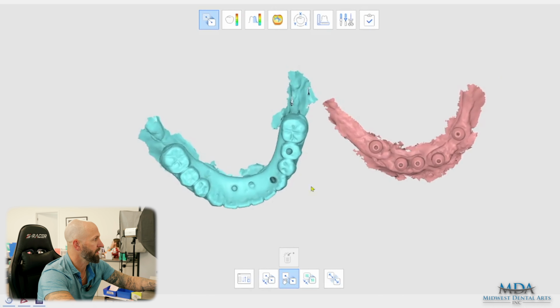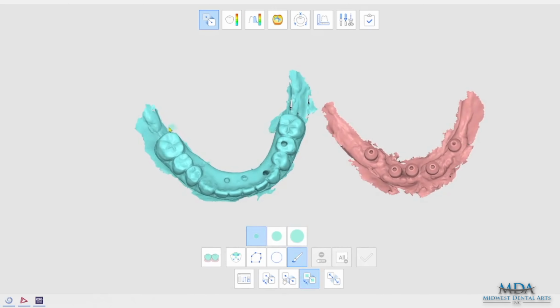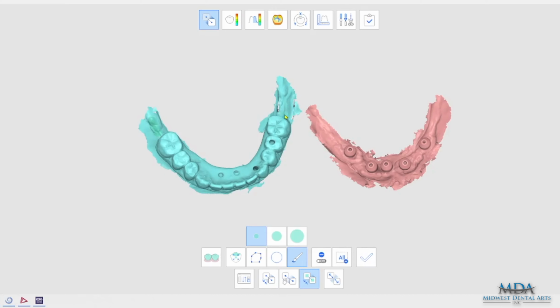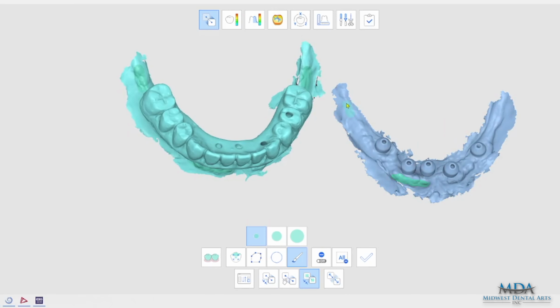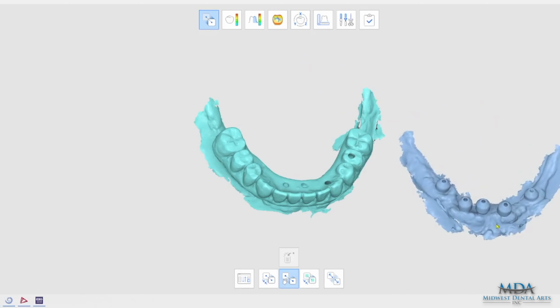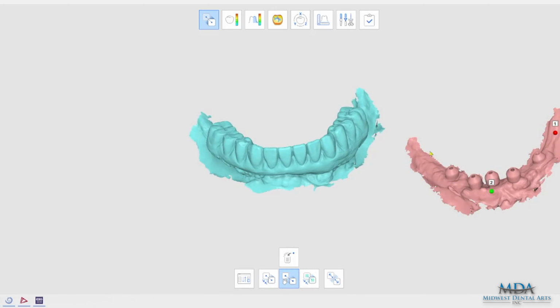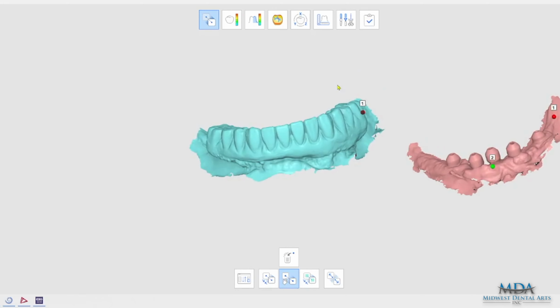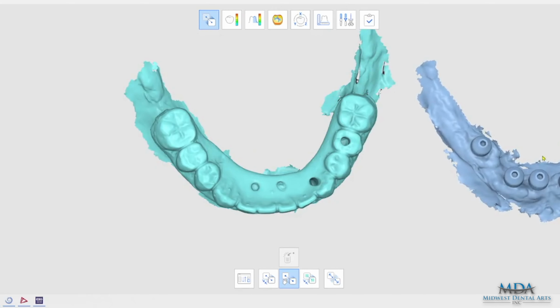There's a screw axis here. You can also use this tool and trace. So back here, here, come in here. You can see, sometimes it gets out of alignment. Go back. Try that one more time. 1, 2, 1, 2. So that's the problem with the lowers.